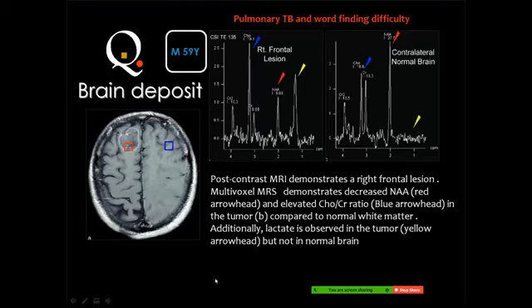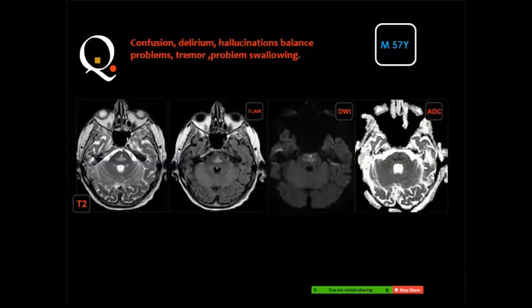Then one of the good policies is to go first and look for the choline peak. If the choline peak is not present, think of other diagnosis rather than a neoplastic etiology. I will show to you some of the examples concerning spectroscopy during this session.